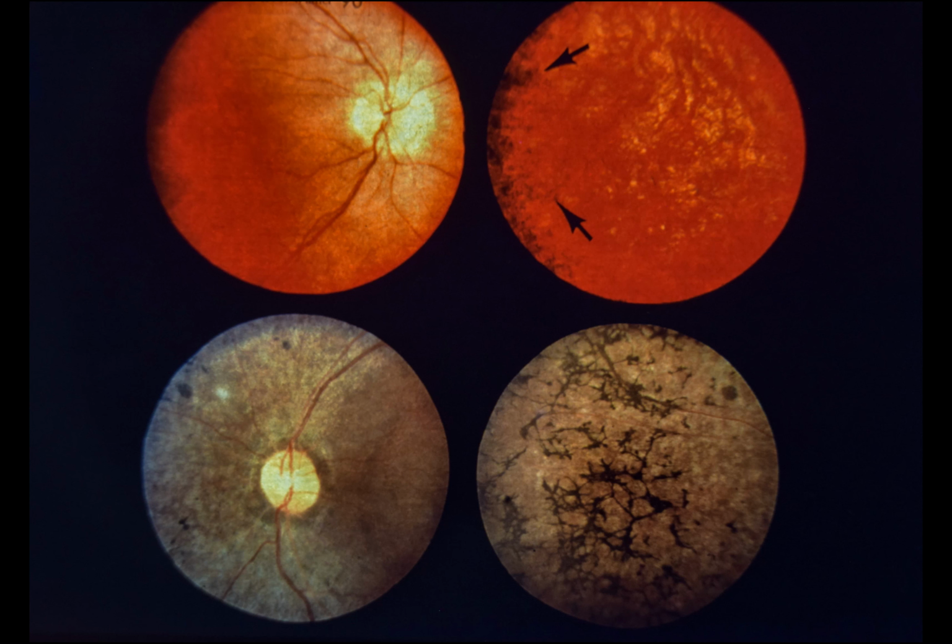The right optic disc is normal, but the retinal arteries are attenuated. The macula has pigmentary changes. The peripheral fundus has a blonde appearance, and there is pigment migration into the retina. An electroretinogram was extinguished in both eyes. This child has Leber's tapetoretinal degeneration, or Leber's congenital amaurosis, an abiotrophy of the retina and retinal pigment epithelium.